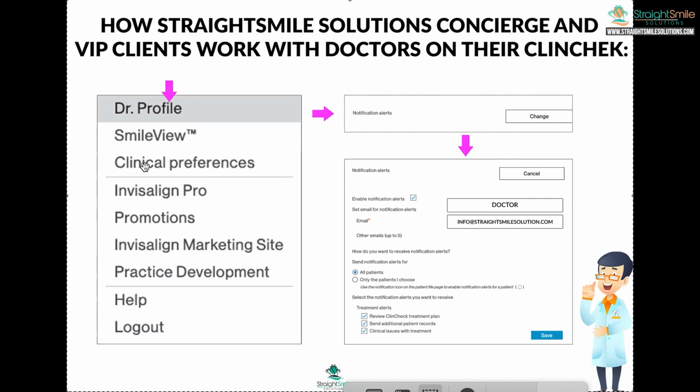Other thing you need to optimize, of course, is clinical preferences. You'd be surprised how many people have some wacky things clicked there, and that's why they're not getting good treatment plans. So we can tell you what to click so that you get predictable treatment plans the first time around. So go to the doctor profile, hit notification alerts, hit change. And then from there, you go ahead, enable notifications. So many people don't have that enabled.